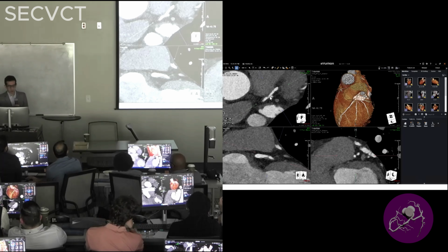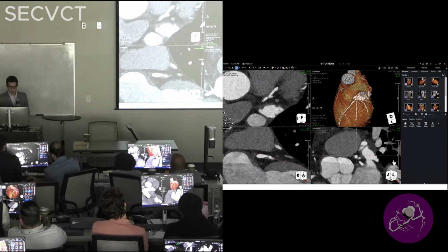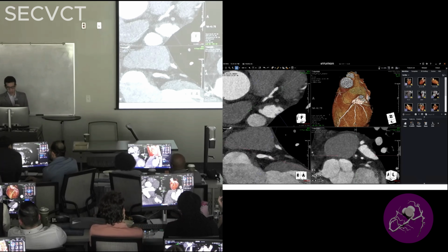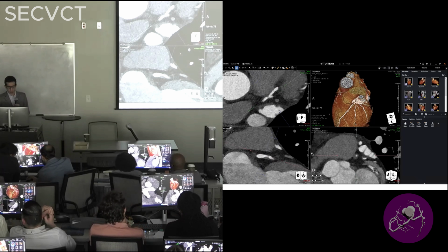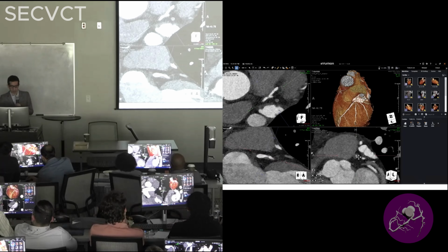So I know we talked about the CPR. Again, there are different ways to assess the degree of stenosis. The way I always confirm is, when you have an axial image, you can go back and find the artery that is free of disease above and below. So for instance, if you come here, although it gave a branch, it might be hard to measure the area, but clearly here there's severe stenosis and it's all non-calcified plaque. So this is purely non-calcified plaque causing severe stenosis in the ostial to proximal LAD.